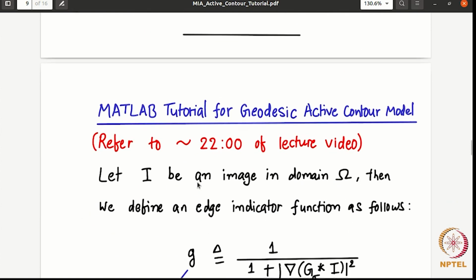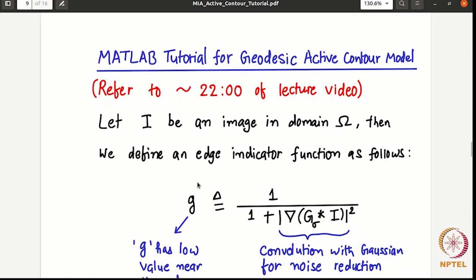After this we come to the next model, which is geodesic active contours. In snakes we were explicitly evolving the position of the snake curve, like snake points, snake coordinates, by tracking the position of its points, right? We had some points initially and we were tracking their position. In this approach we use level sets.